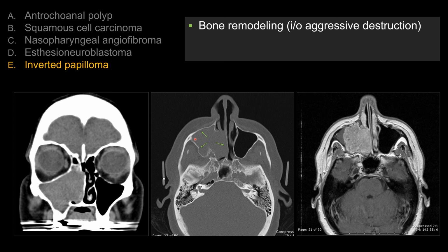cell carcinoma, for example. Also, you see that there is complete filling of the maxillary antrum, or the maxillary sinus cavity, widening of the ostium with extension into the nasal cavity. So this pattern alone on CT, choice A and choice E are probably the best answers here.